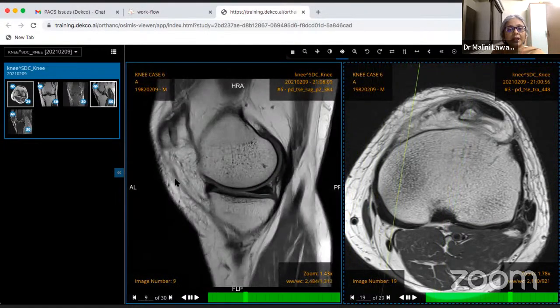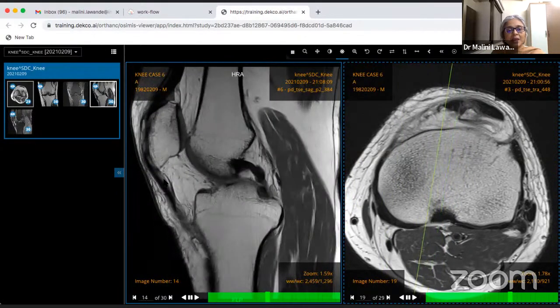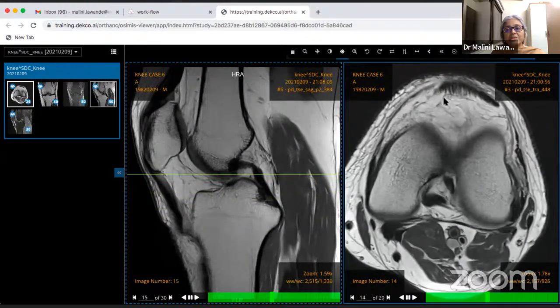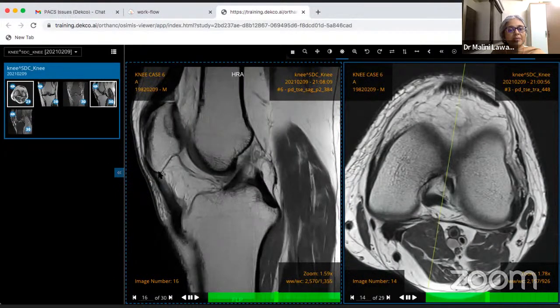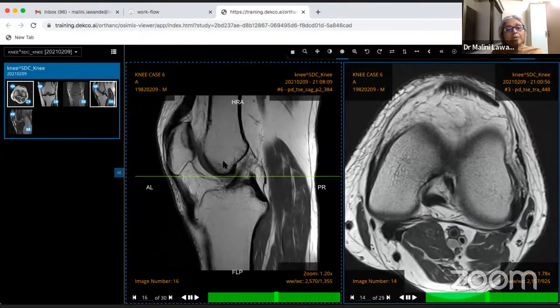which is nothing but patellar tendinosis at the patellar attachment. So at this level, you may see hyperintense signal. As I said, always correlate with the axial images. Right at this level, there is not much happening on axial, so that may not be real, it can be a little artifactual. If there is localized tenderness, and on axial you also see it thickened and showing bright signal, that is suggestive of patellar tendinosis. Another problem is when there is a quadriceps tendon tear and the tendon gets retracted here.